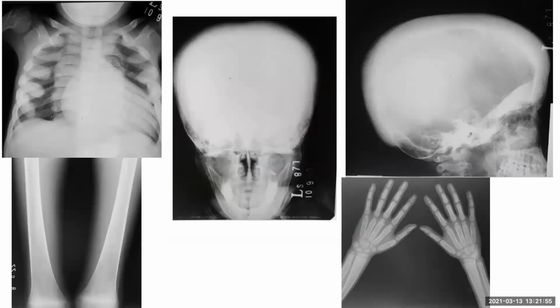Okay. This is the skeletal survey of the patient. These are the selected images from the skeletal survey. This chest is another patient, but the rest is the index case. In the skull, AP and lateral view, I can see the expansion of the diploic space with the hair-on-end-like appearance, which is typical of thalassemia or other hemolytic anemias.